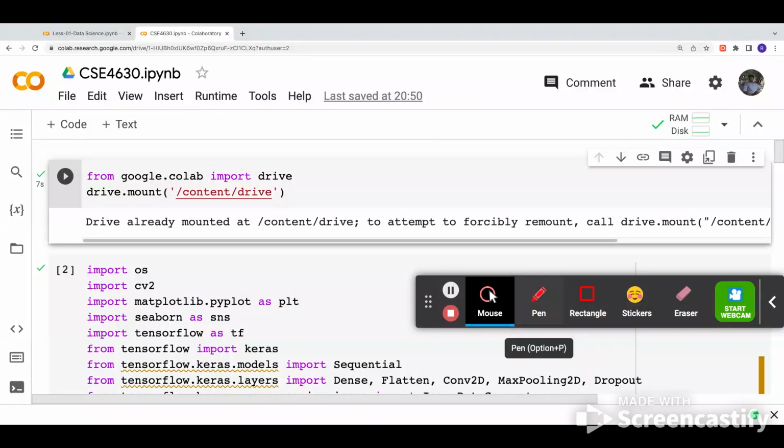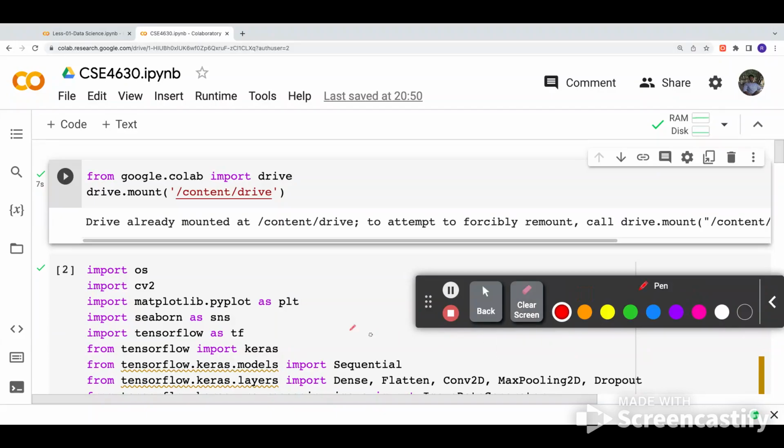Since, as you know, Google Colab is the easiest way to run and compile the image analysis system. That's why we use Colab. And if you have data in your Google Drive, you can easily access it through Python. So that's why we need some libraries to import and accomplish this operation.